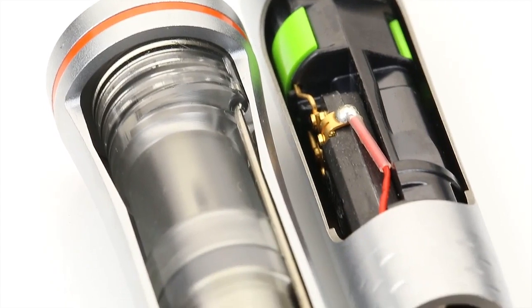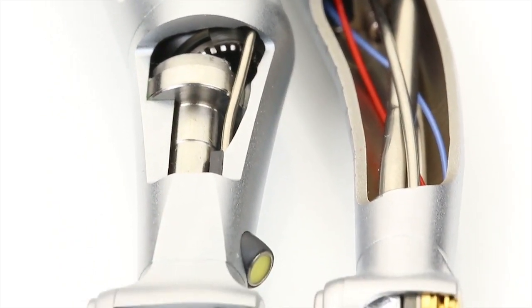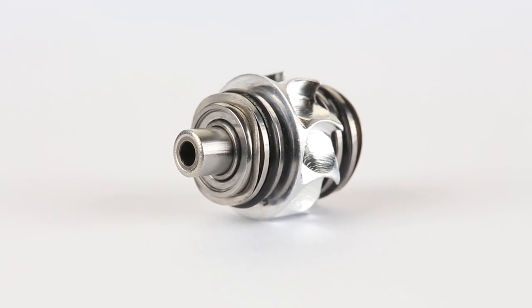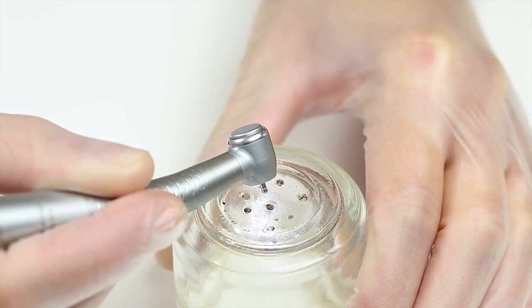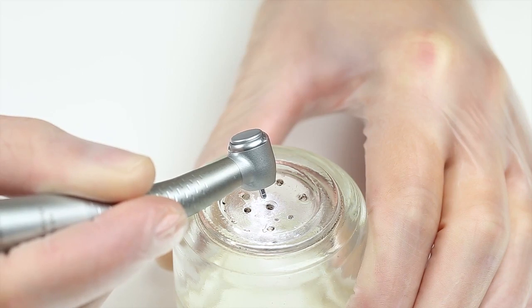Air-driven dental turbines are more lightweight than red contra-angle handpieces, need no additional motor or control, and require less investment. As these turbine handpieces are only driven by a small rotor, their power is limited and seriously dependent on the contact pressure. Setting the speed is generally not possible, and the high-frequency operating noise is unpleasant for many users and patients.